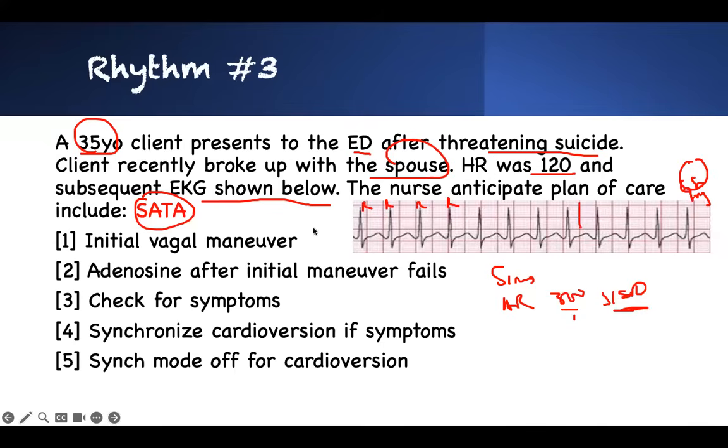And then I look at the P wave, you can't even see it. It's buried with the T wave. It's too fast. The T wave, which is the repolarization of the ventricle, is now being buried with the atrial depolarization. When you see that, that means there's no time for the ventricle and the atrium. They don't have time for each other. There's no relaxation. So this is a fast rhythm. The QRS is no greater than 3 boxes, so that's good. The P wave, you can't even figure it out.